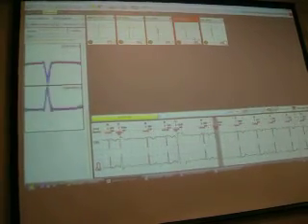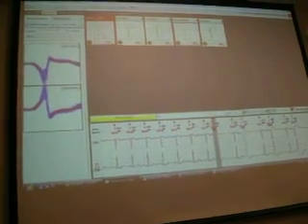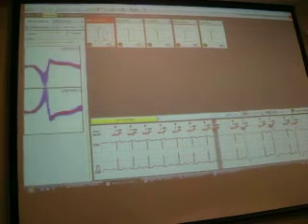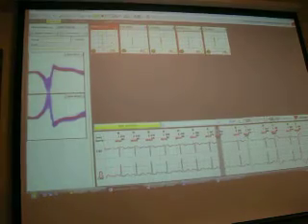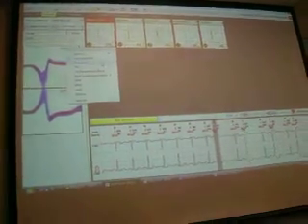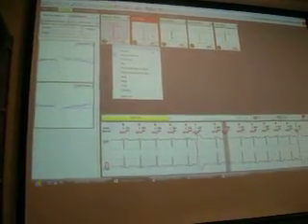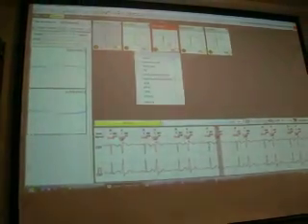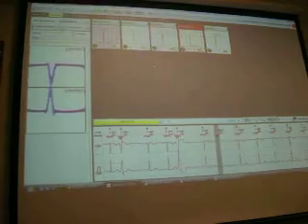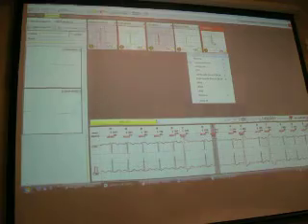I check every one of them, and at last I set the correct type. The correct type, I think this is ventricular rather than supraventricular. The next is supraventricular, correct, and then rather ventricular, supraventricular, and the last is ventricular.